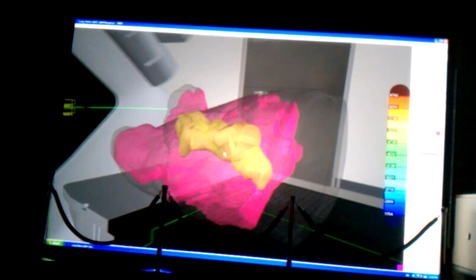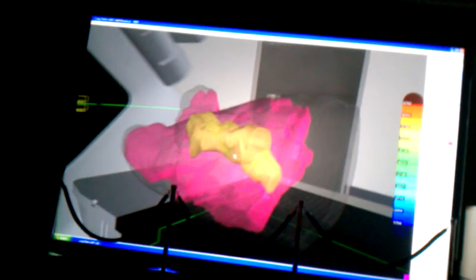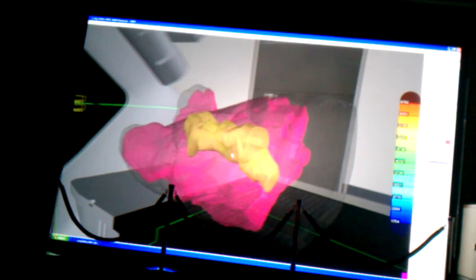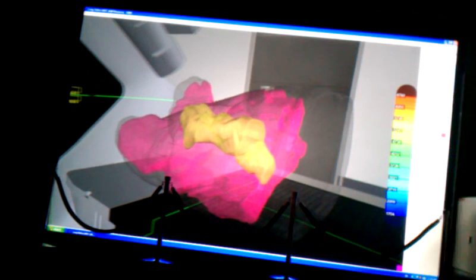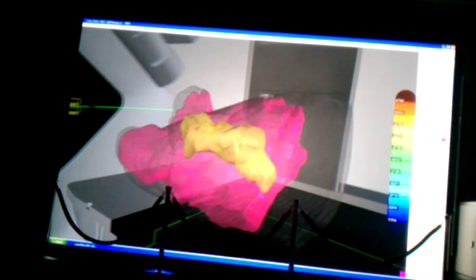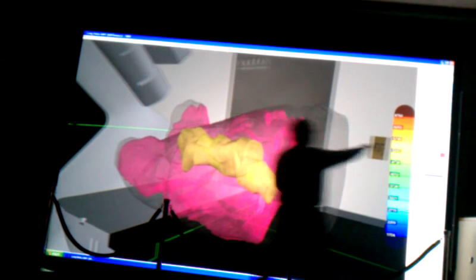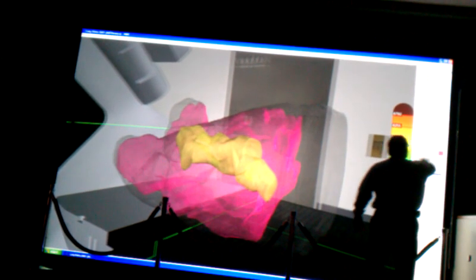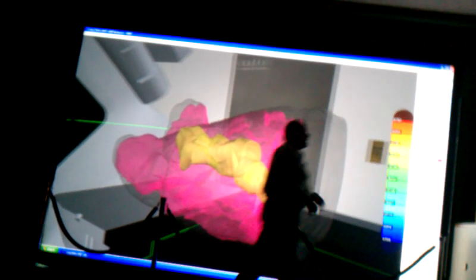This was not done, but what we're able to do also is turn on what we call dose clouds for each patient in each tumor area, and really see how much area is receiving how much dose around the area. This is our color gradient on the side. It's going to tell us in centigray how much dose our patient is actually getting to different structures inside of the body. If you see the pink box right here, the pink box is saying that the area is getting 1,014 centigray, or rad.